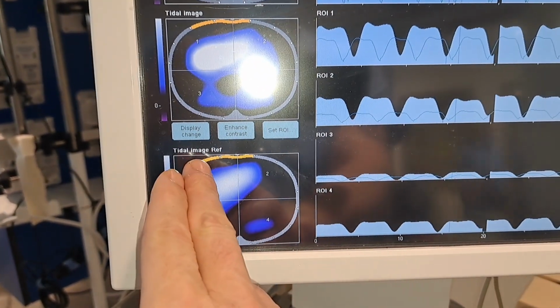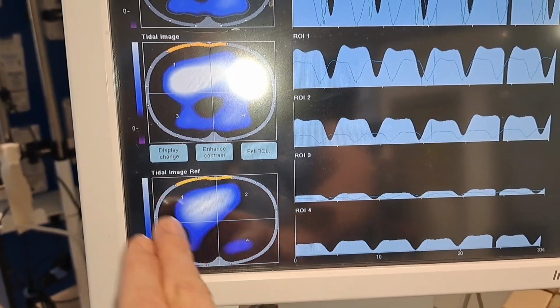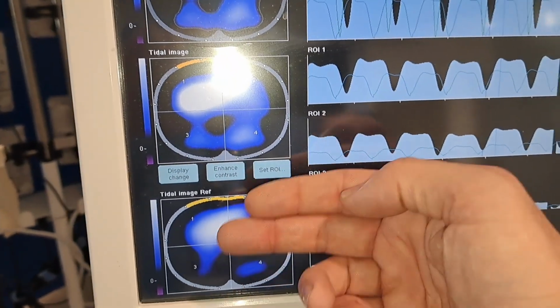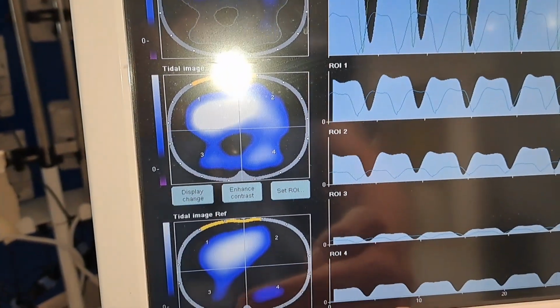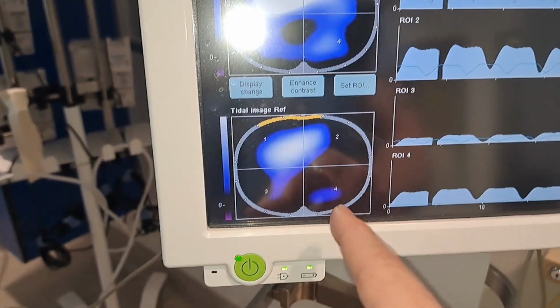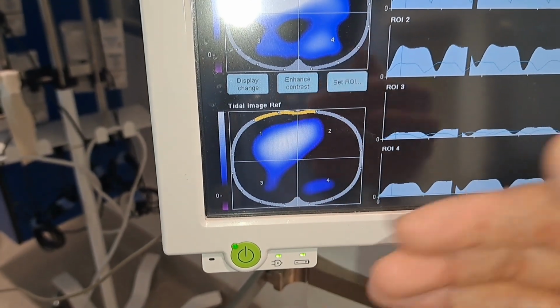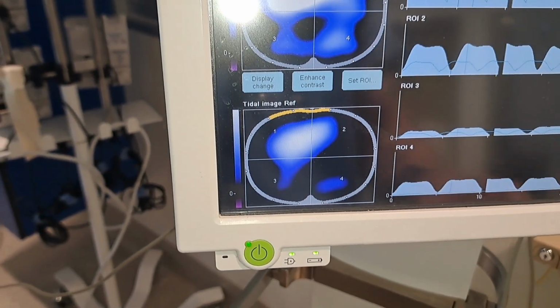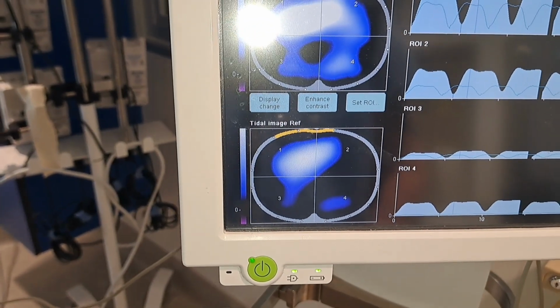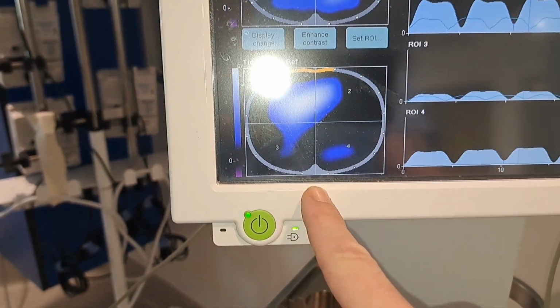So this would be the right upper part of the lung, the anterior part, the dorsal on this side, anterior, dorsal. We often refer to ventral to dorsal. But anyways, all to say it was ACPC. There was a PEEP of 10. The peak pressure, like the pressure control, was set at 30. So that's a delta of 20. And 60% FiO2. So this is the baseline here.